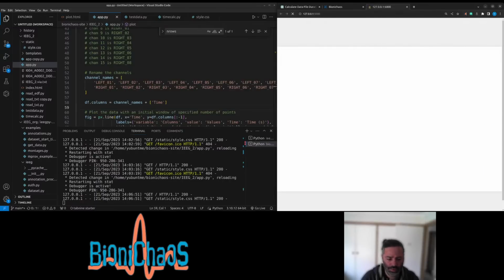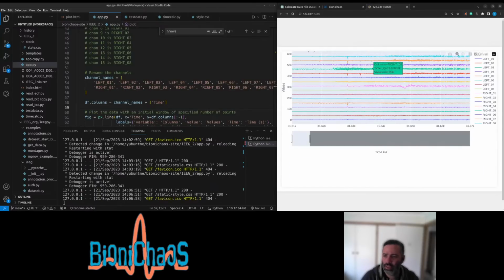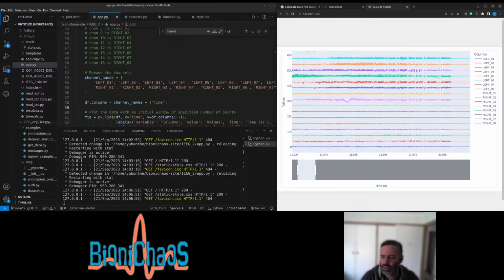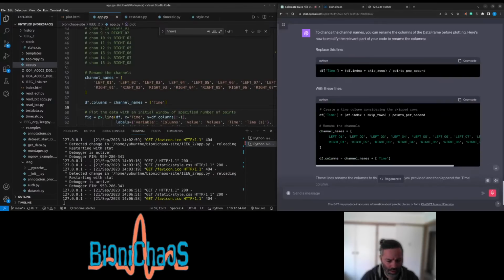Change the names. Yes. And why aren't they in order? Any idea? In what order are the channels displayed on the chart?